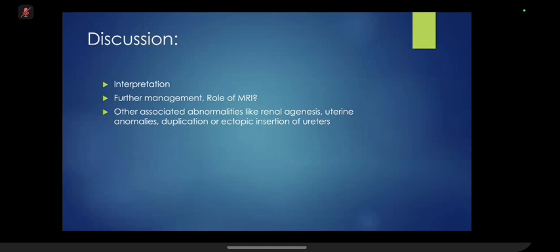So try to think about it in a way that you are putting the catheter in one organ, like in the bladder, and if another organ is getting contrast opacification, so that means it is not the normal anatomy we expect in the patients.